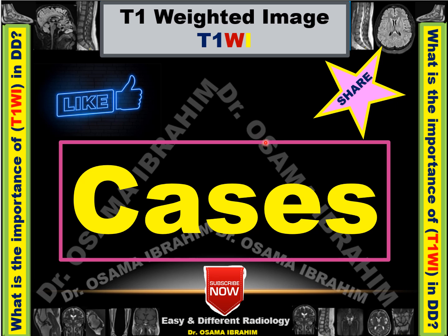Now we'll start our 5 cases, which I presented at the start of this presentation, and see how we can reach the final diagnosis with the help of the T1 weighted image and its best friend, the fat suppression sequence.